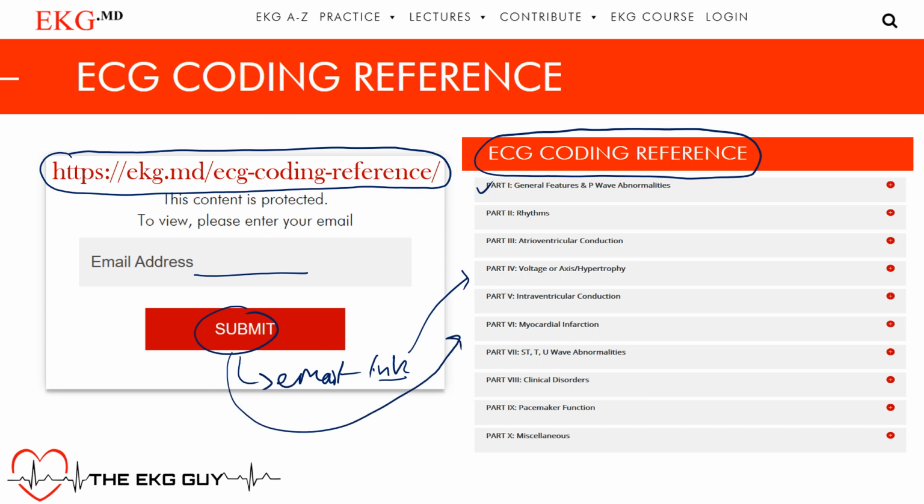So we've gone through part one, the general features and P-wave abnormalities, where we looked at atrial enlargement, both left and right and biatrial. We've gone through some rhythms, and we're still in this section here in rhythms, okay? And we're going to be looking at this point at atrial flutter. We'll touch a little bit more than usual on some of the management, some of different forms, typical and atypical forms of atrial flutter, and just the general pattern, okay? So we will be getting to that here shortly.